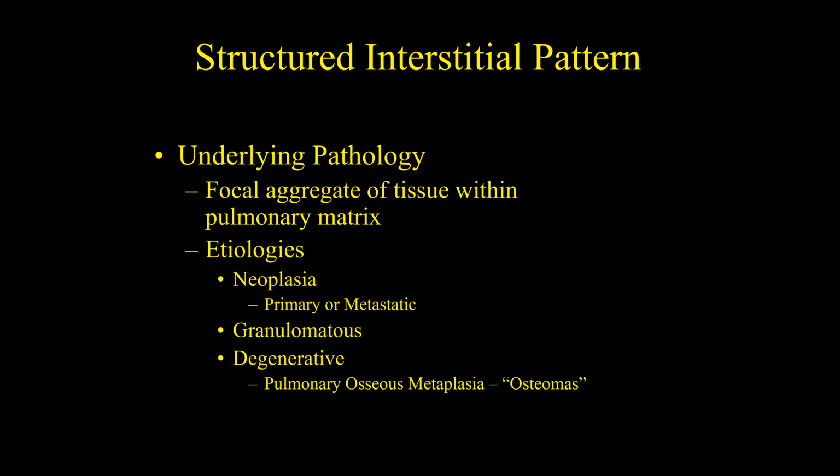Typically, if it's cranioventrally located, it's due to pneumonia. If it's caudal dorsally located and the heart is big, particularly the left atrium, it's usually cardiogenic pulmonary edema. If it's caudal dorsally located and the heart is normal, it's typically non-cardiogenic edema or neurogenic edema. If you're a cat or a Doberman, you don't follow the rules.